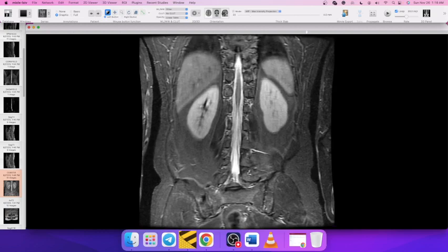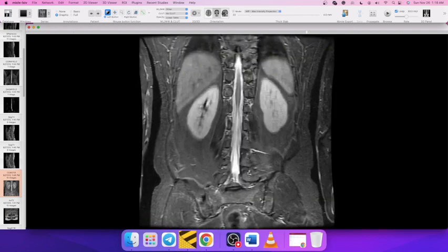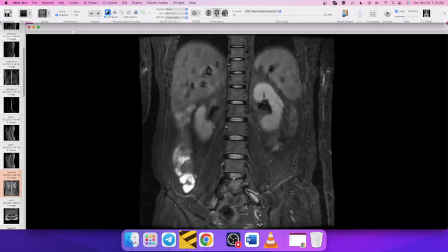There's definitely hypointensity in these joints. These are STIR images, so they are fat suppressed, and these areas might have been hyperintense on T2 but are appearing hypointense. So probably some amount of chronic sacroiliitis going on, but definitely no marrow edema, no acute sacroiliitis here for sure.